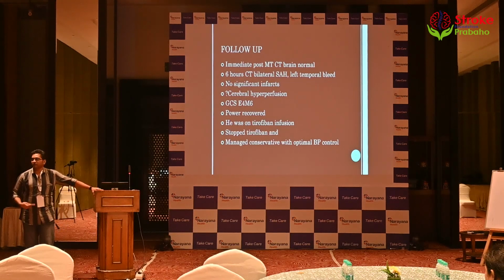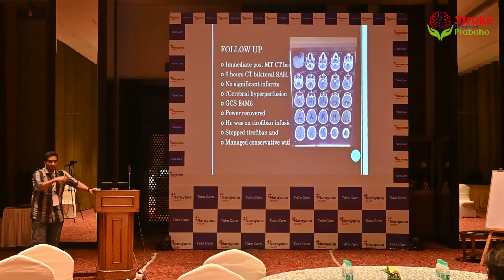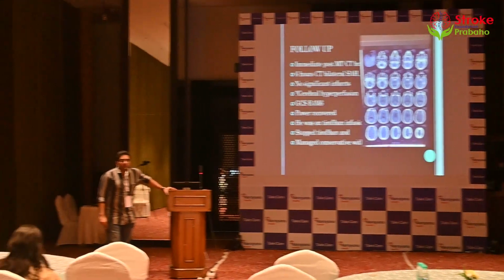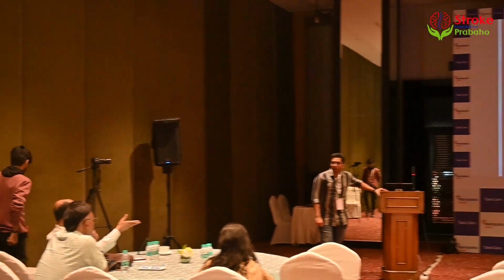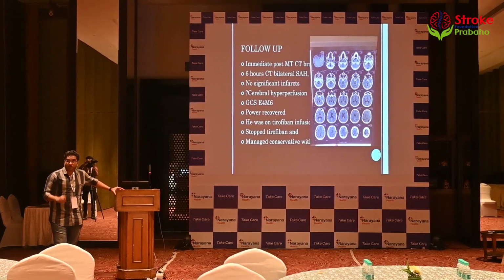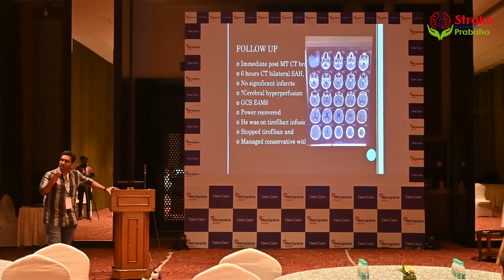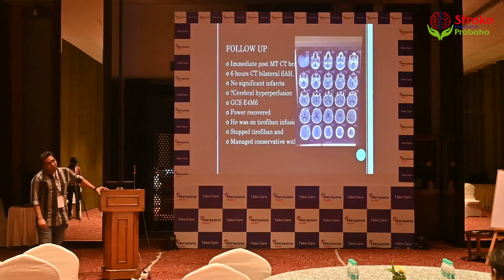So any thoughts or words? You say that there has been a hemorrhagic transformation, right? So a hemorrhagic transformation of an infarct. Of an infarct, or maybe this is like a post-carotid stenosis reperfusion. So you have to differentiate between the two. There were no new infarcts. So if it was not an infarct on the MR, then how can you have a hemorrhagic transformation of that infarct? So it's not a hemorrhagic transformation. We'll call it a reperfusion injury like we do in a carotid revascularization. But the place would be very, very unlikely, right?